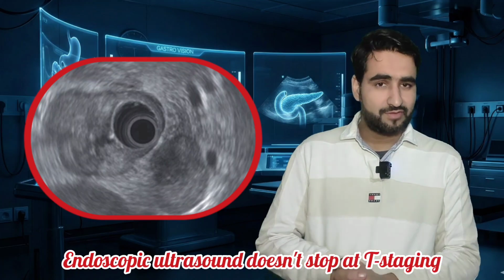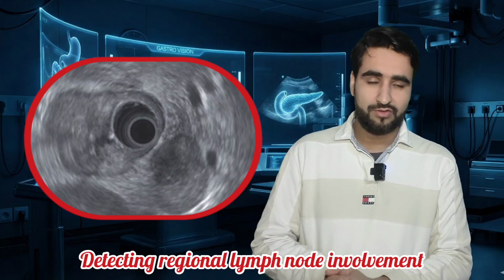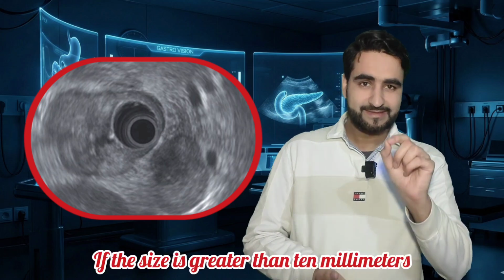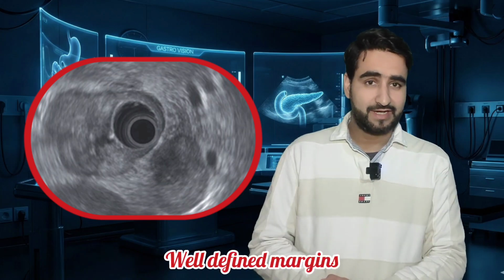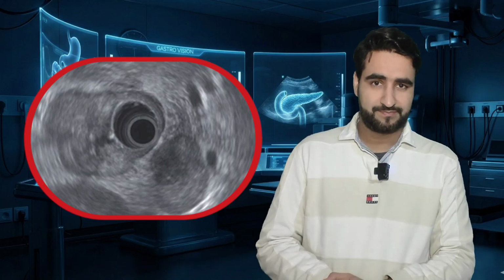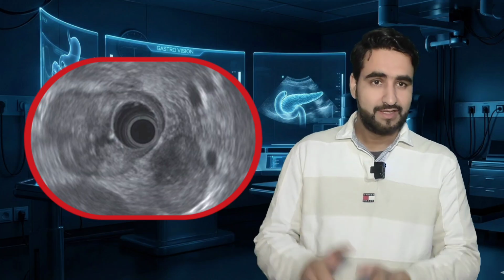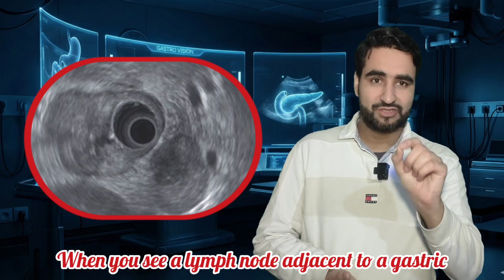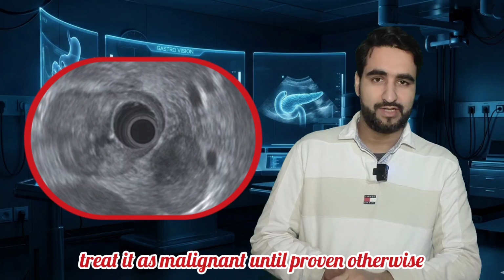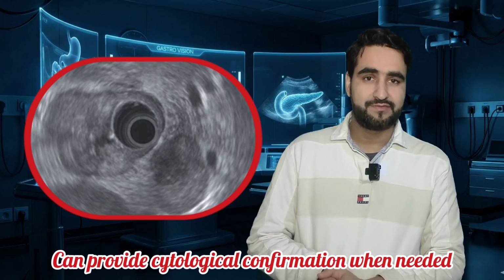Endoscopic ultrasound doesn't stop at T staging, it is also our best tool for detecting regional lymph node involvement. Now, coming to the malignant lymph node features on endoscopic ultrasound: size greater than 10 millimeters, well-defined margins, homogeneous hypoechoic echotexture, and round shape. The more of these features present, the higher the suspicion for metastatic nodal involvement. When you see a lymph node adjacent to a gastric tumor with these characteristics, treat it as malignant until proven otherwise. Endoscopic ultrasound guided FNA can provide cytological confirmation when needed.